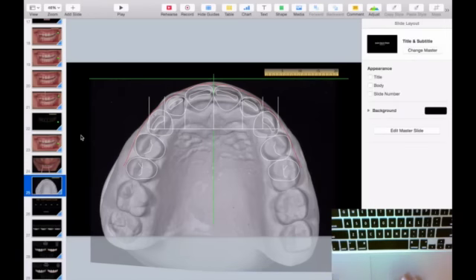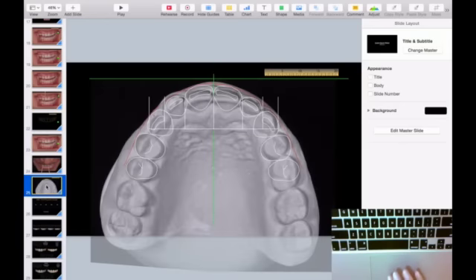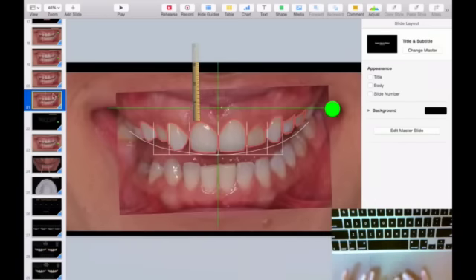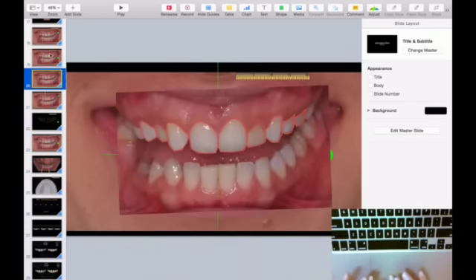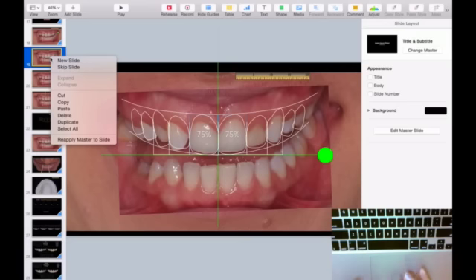So here we have our occlusal view. Now you have your three views, frontal, 12 o'clock, and occlusal. You can also place them all in the same slide and make it easier for every specialist that is involved in the case. Now, since we have already all our reviews, all that's left for us to do is our simulation, so the patient can see themselves with this new smile.